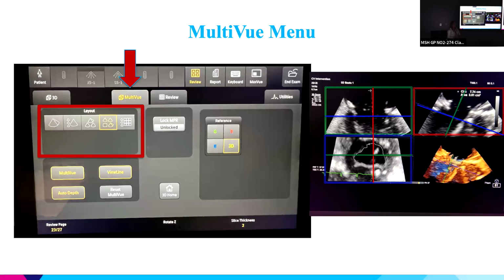This is a display, how you want your images to be displayed: single, 3x1, 3, 4, or you can even do a grid view. The second section is the reference planes, and I'm going to get into a lot of detail with that. And the last thing I mention, but the most important, is the lock planes in the middle.